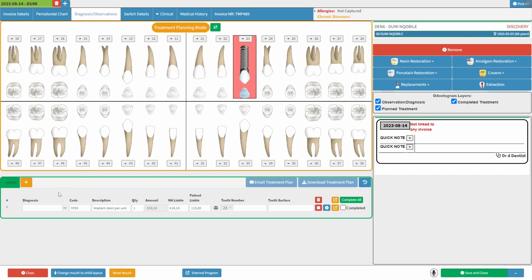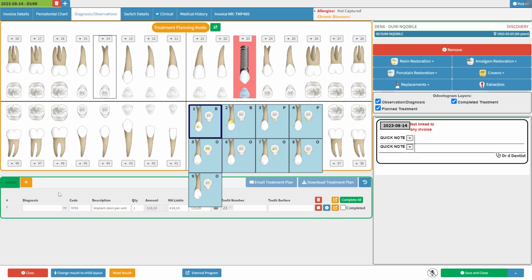The dentist can utilize this function to state a specific task to be done. For example, say Web 14 Resin 1. The system will prompt you to now specify an option for this task. For example, say 1.